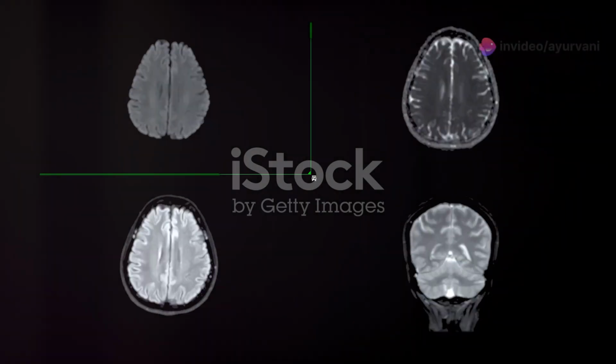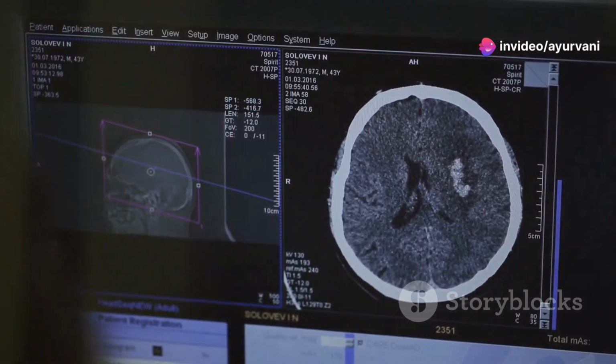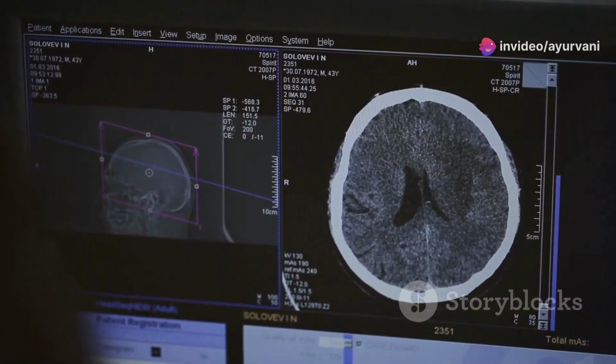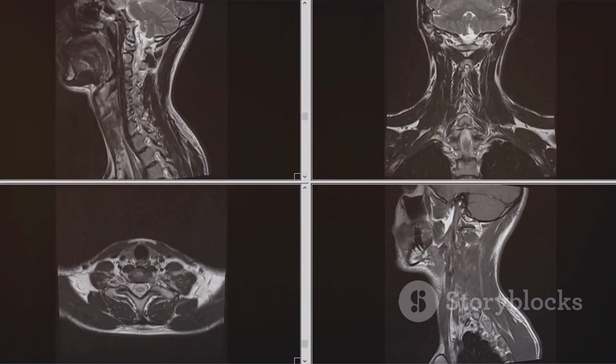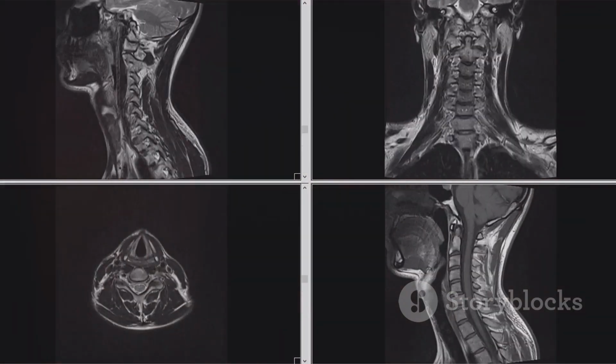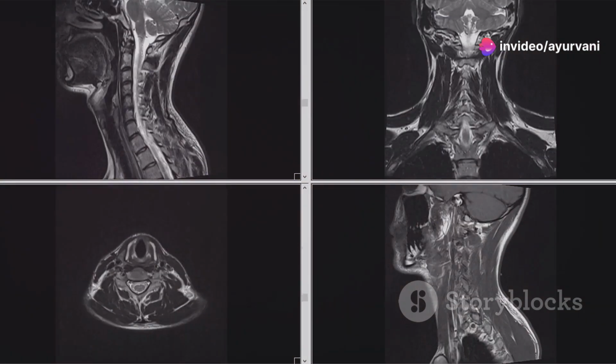Moving on to gradient echo and susceptibility weighted imaging. These sequences are particularly sensitive to blood products even in minute quantities. You'll see blooming artifacts in areas of hemorrhage, which can be pivotal in detecting microbleeds or small hemorrhages that might be missed on other sequences.